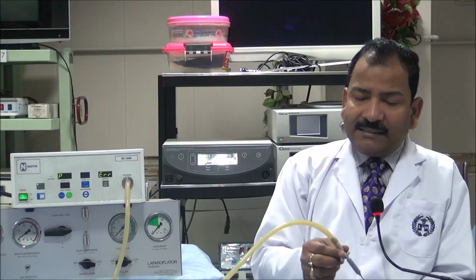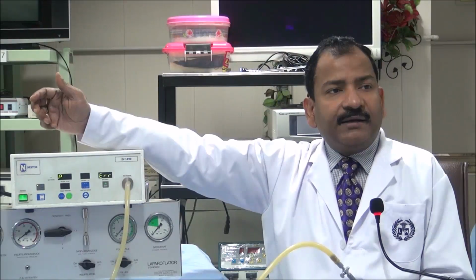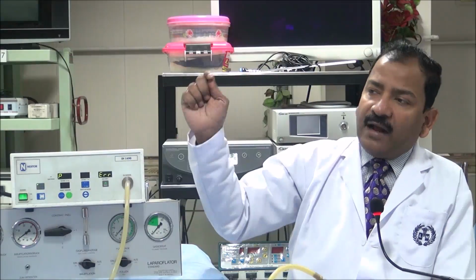If I have attached the Veress needle and then I switch on the insufflator, then first what will go? Air. Just like if your nurse puts the IV cannula and then attaches the IV tubing to the cannula first, and then attaches it to the bottle, what will go first? Air. So she must flush the air out.